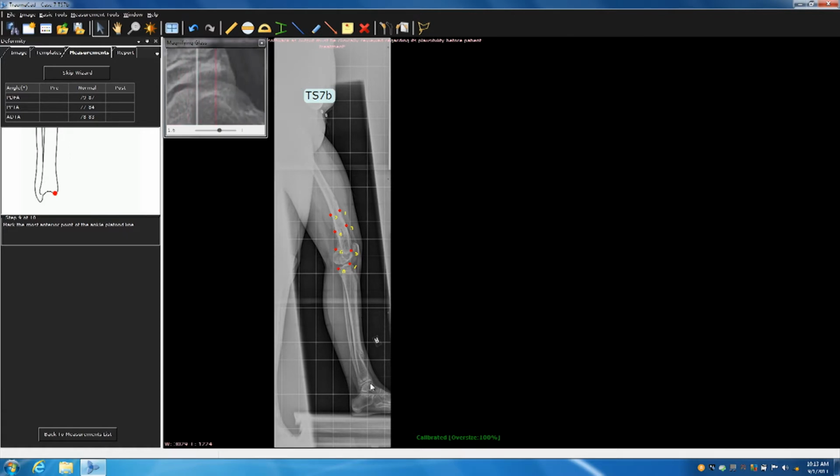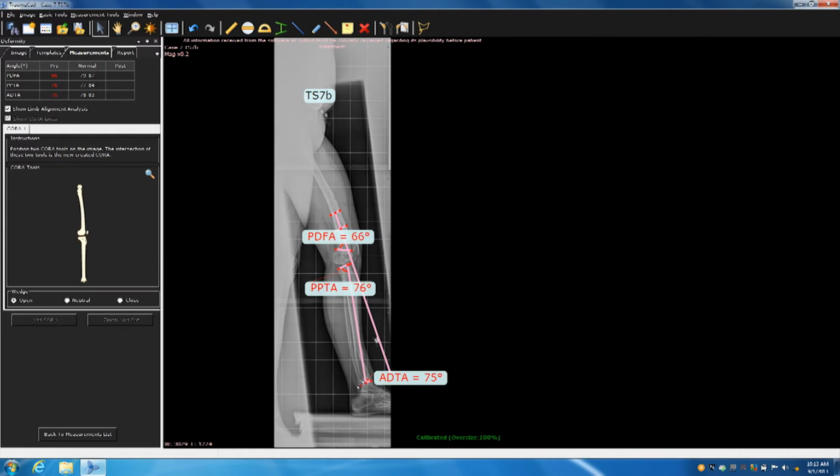And then if you look at the ankle, the medial malleolus is a little bit rotated. You come to the sclerotic anterior border. And some of these, in the old courses, we would have all paper dolls, and it's like you put it here and here, and then you go home, like, where do you put it? Some of it's a gestalt, it's kind of a feel, and that's where the art comes in.